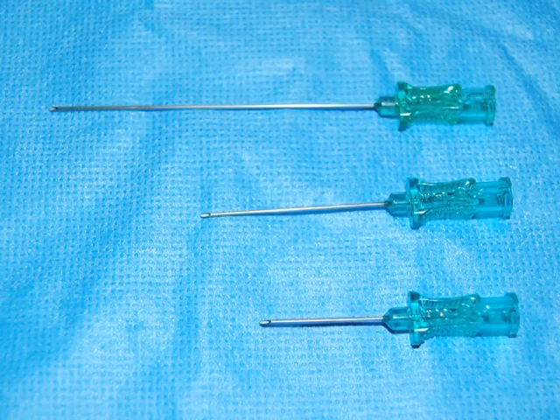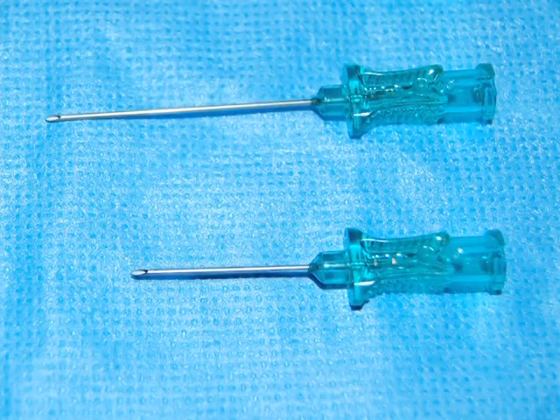For the micropuncture needles, these are generally 21 gauge needles. Some have a long segment, others are short segments. The micropuncture needles create a smaller entry hole and less back bleeding is identified, but they are excellent for radial access and can be used for femoral access.